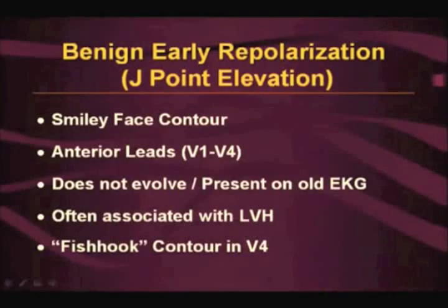So this is a picture. You will never be 100% right. We are all going to make mistakes, but you're going to get closer to 100% if you use these features. And then finally, the fishhook contour in V4.